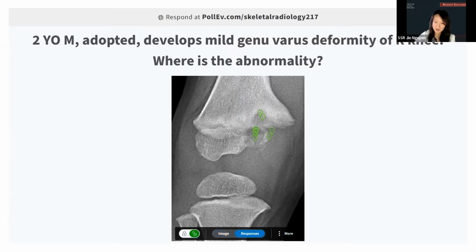Oh, wow, you guys are really good. We're going to split hairs a little bit and look deeper into this area, because I know some of you are hovering over here, and others are hovering up there. So is it the epiphysis? Is it the actual growth plate, or is it actually sticking into the metaphysis? The next modality that we typically use for imaging children is not CT, but MR.